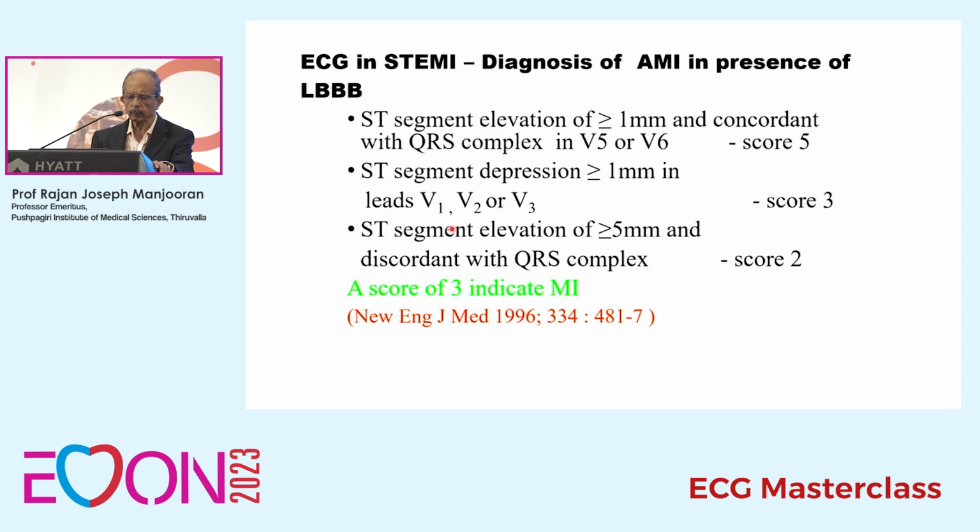And if you look carefully, this patient is having Q waves in V1, there is a rudimentary R in V2, the rudimentary R in V3, there is a Q wave in V5, and this also is a very rudimentary R wave, all indicating that the patient had a previous myocardial infarction as evidenced by Q waves in the chest leads. So he has got previous myocardial infarction and a trifascicular block.